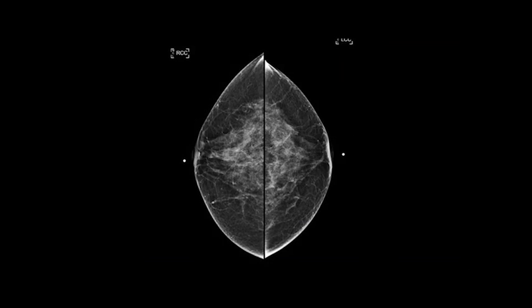Here are the images. I like the nipples. The nipples are perfectly centered. I like that. Little folds out here, but not bad, and lateral, and here's the medial tissue. So the radiologist felt there wasn't good retroglandular fat or posterior tissue.